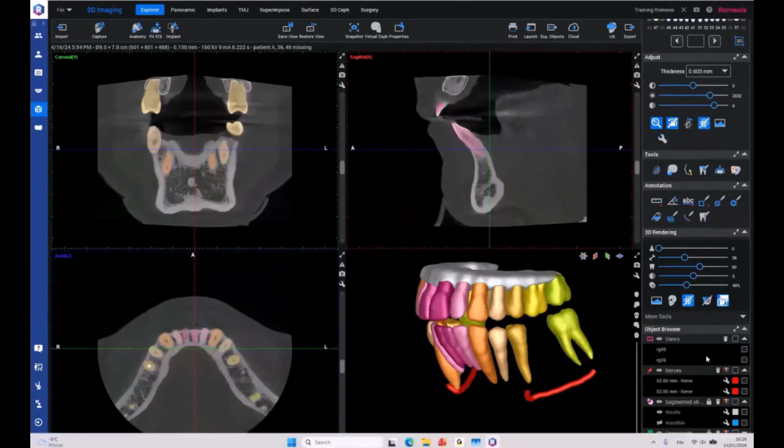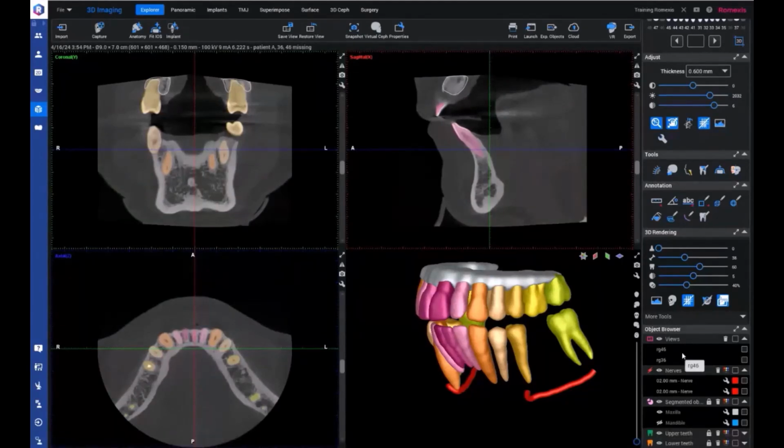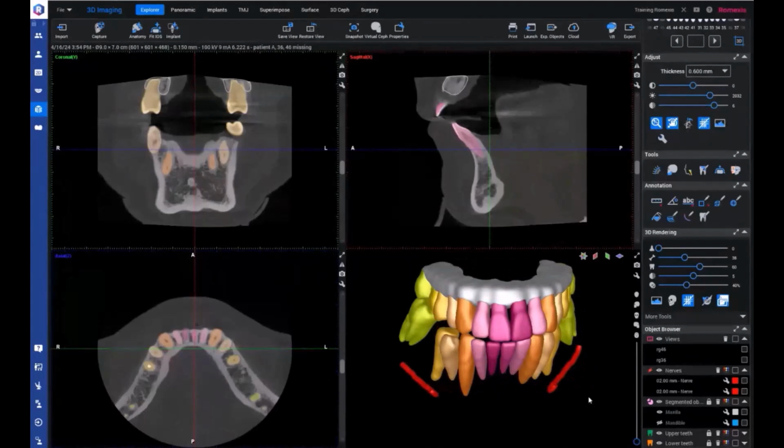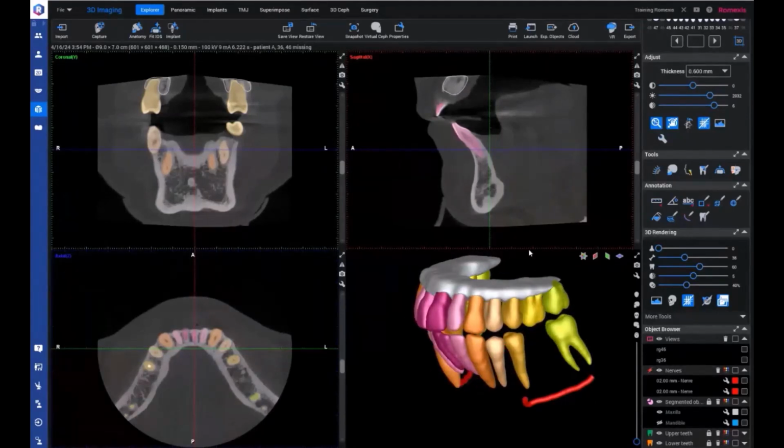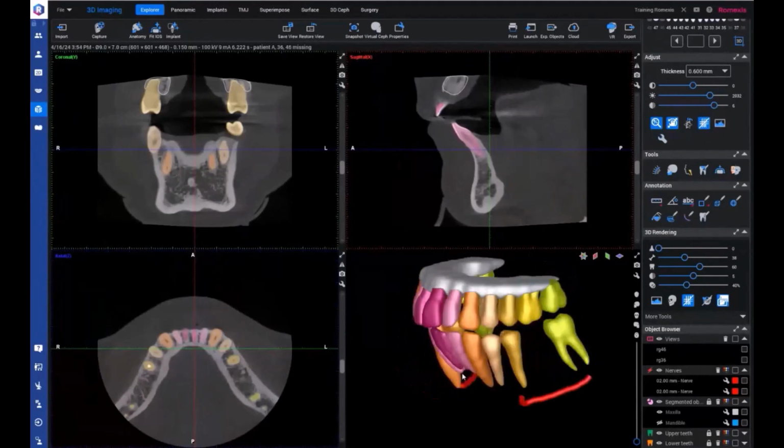And of course, if we think of it, typically patients don't understand much about the grayscale images that they see here on your screen. So all these segmentations can help a lot with the conversations with the patient. And then also, of course, the 3D printed models where they can see everything in real size.